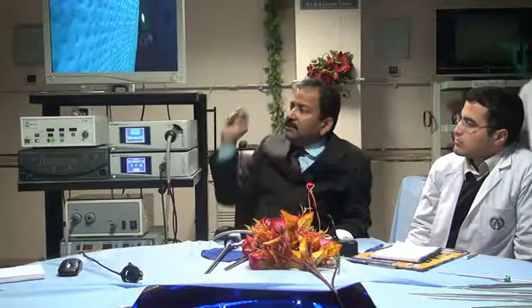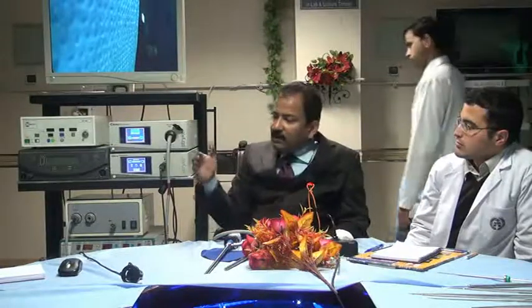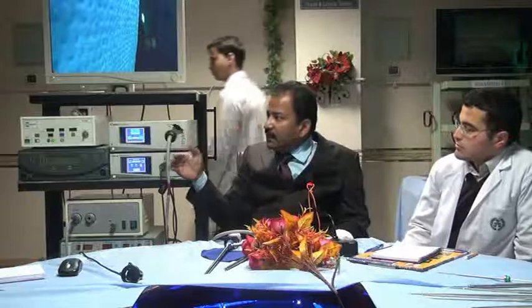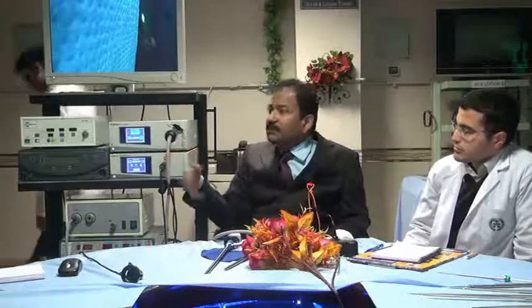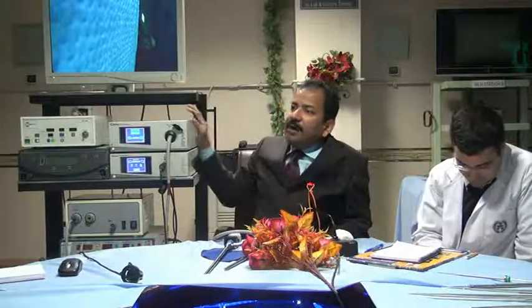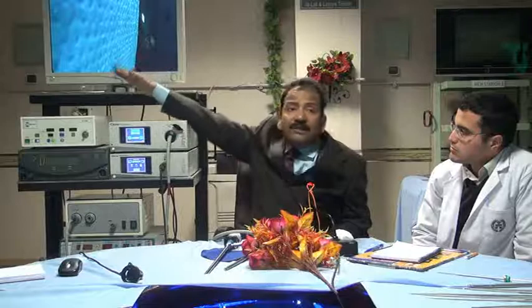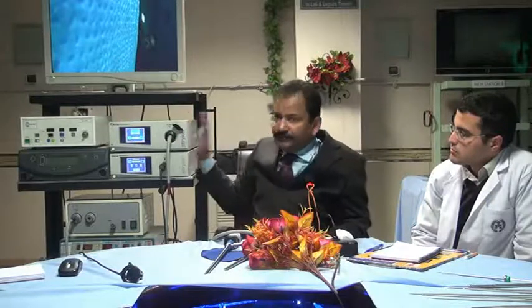And in the pixels there are no moving electron particles. It gets illuminated, so the quality of the image in the digital is much sharper, much digitally enhanced, and you have a lot of parameters here to control: the filter, shutter speed, aperture. Those controls are not there in the analog. I am coming to that one.